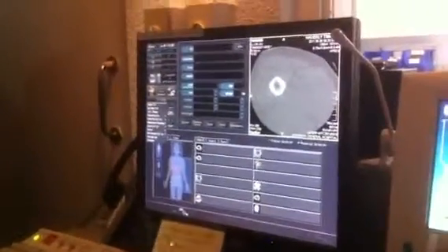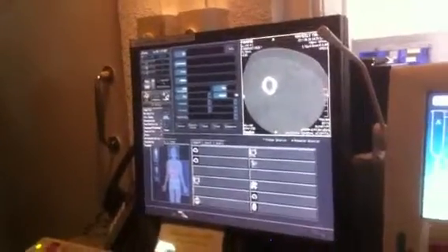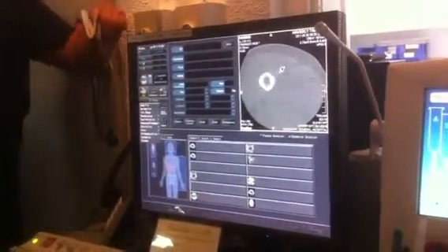Someone's going to need to write down that you use the boost because you already set it up. I set up the boost for all of us. This is just in case you have a head and face.